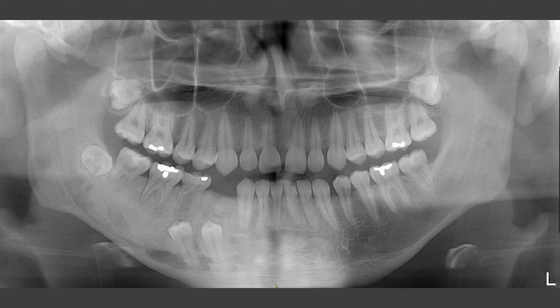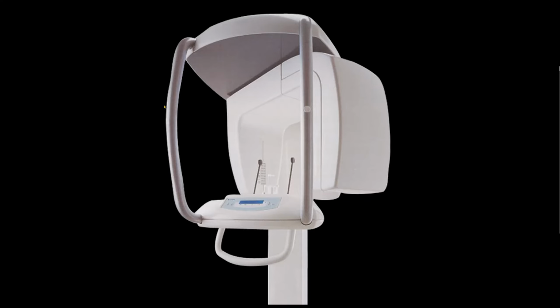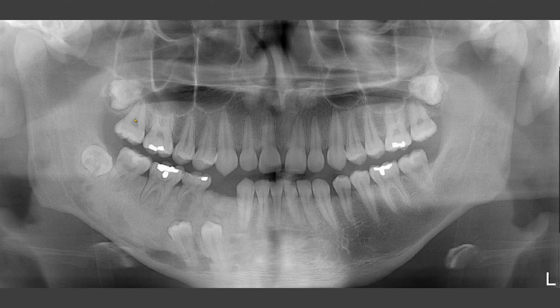We have, although, missed the chin. The tongue is mostly in contact with the hard palate. The linear band and the oval radiopacity that we see are part of the head positioning guide. The shape of this guide varies from machine to machine. So this is how this unit looks, and this is the head positioning unit, a straight rod with a circular device. Coming back to the radiograph, I can see that the deciduous right second molar is retained.